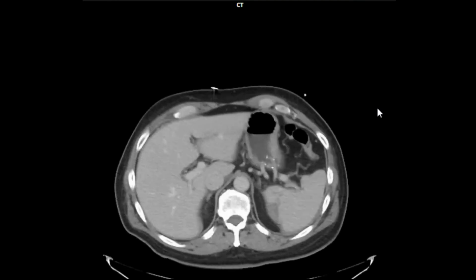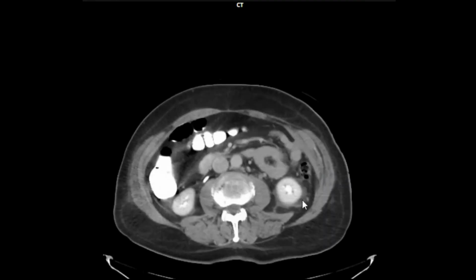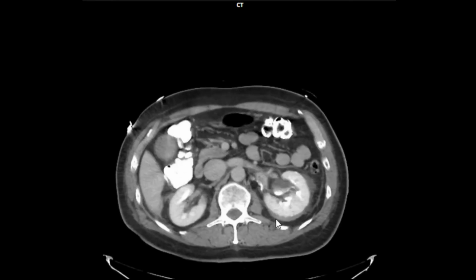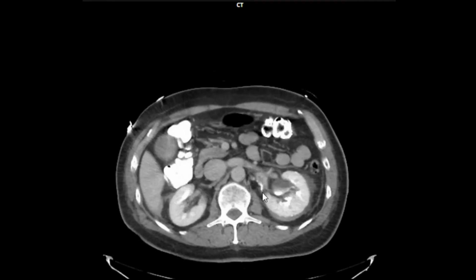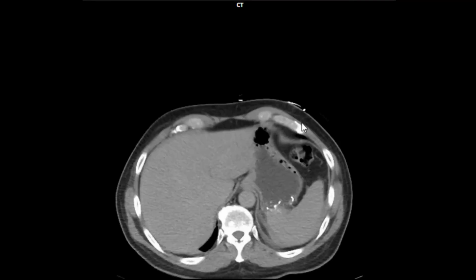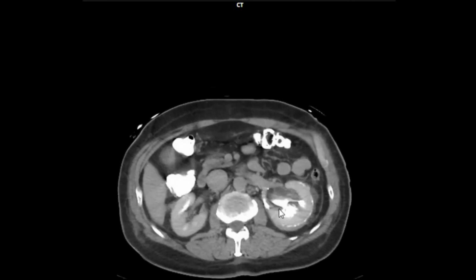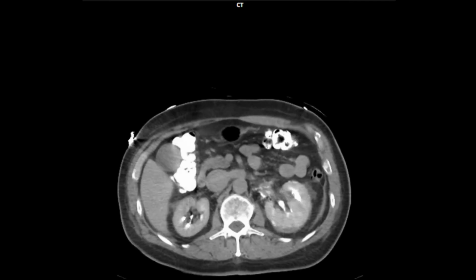This case involved 2 image sets, and this is in the venous phase, and the finding is with the left kidney we can see some material around the left kidney and some contrast material appearing to layer in this region over here. And on delayed images, we can see that there's an increased amount of material outside of the collecting system and also surrounding the kidney. So this is a case of traumatic urine leak.